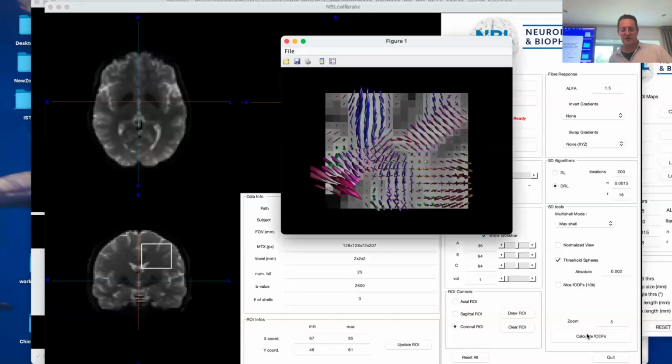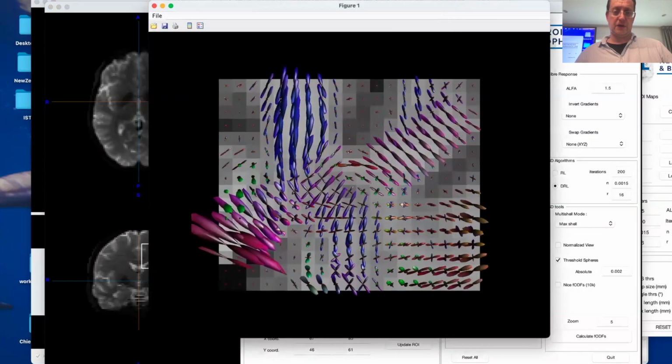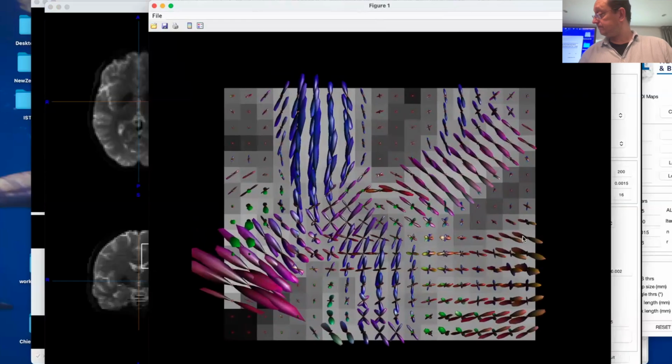And now it's going to generate this picture. And now you see something odd. Something is not adding up, because this is a corpus callosum. Where is it? Here, this is the corpus callosum. It's not actually building it, it's all in reverse, right? This is again because we used the wrong invert axis. So the plus X is minus Y, and everything is being flipped to the opposite side.